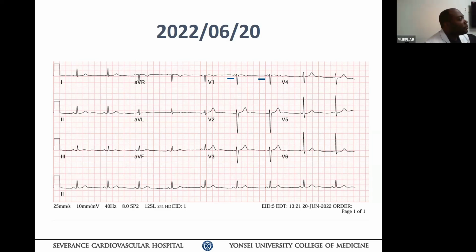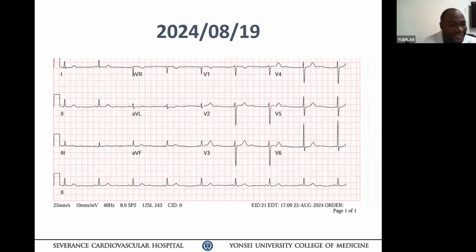Okay. With these blue markers, does anyone have anything to add based on the blue markers on the screen now? You marked? I've highlighted one. In V1, I put 2 blue markers over there. We talk of P wave axis. Here is a very low amplitude. Okay, I'll move to the next. I think there are people with a clean mind who can see something, but I cannot see anything.